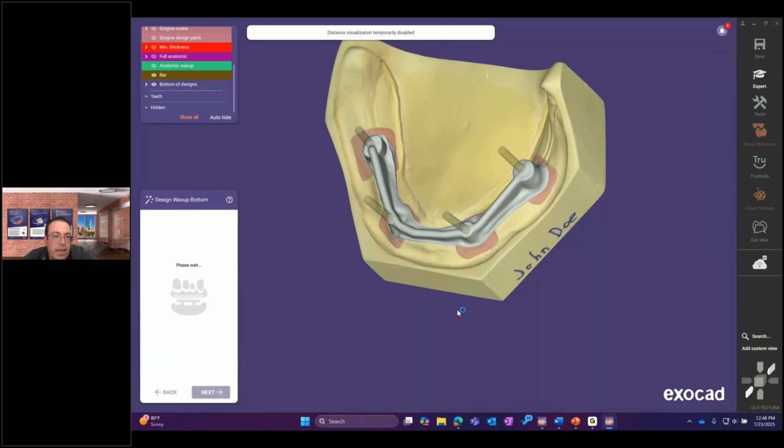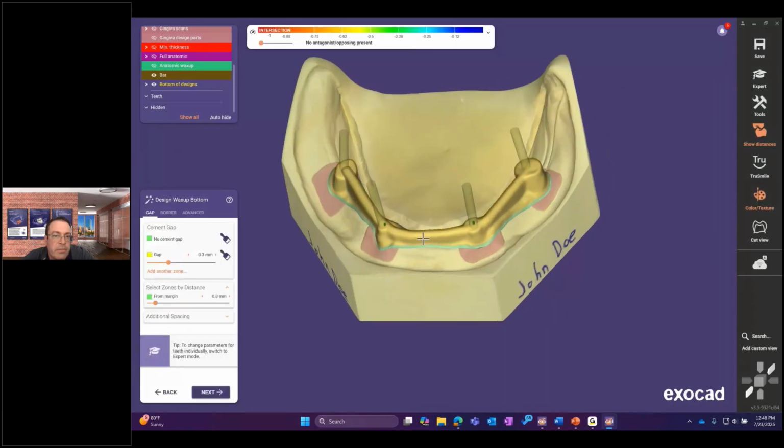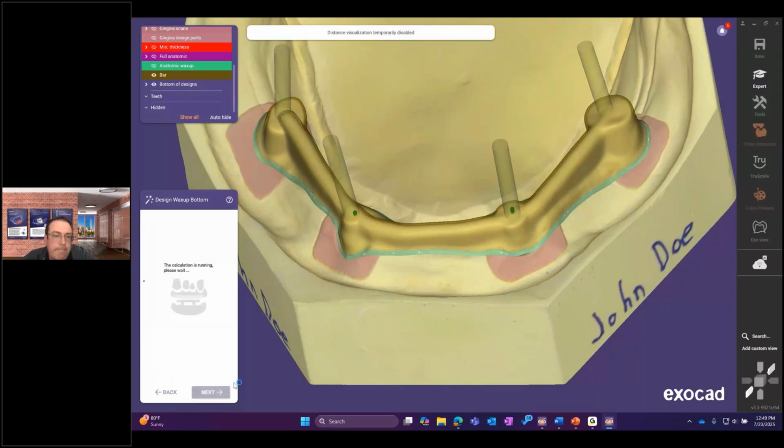So we have actually a bottom step, and we're going to be able to add cement space here. So manufacturing parameter, right? So depending on how the top parts are fitting to your bars, you adjust your cement space here. It'll be a little trial and error process, but it'll figure out what generates a good fit for your production process. And then we'll go to the merge step here.